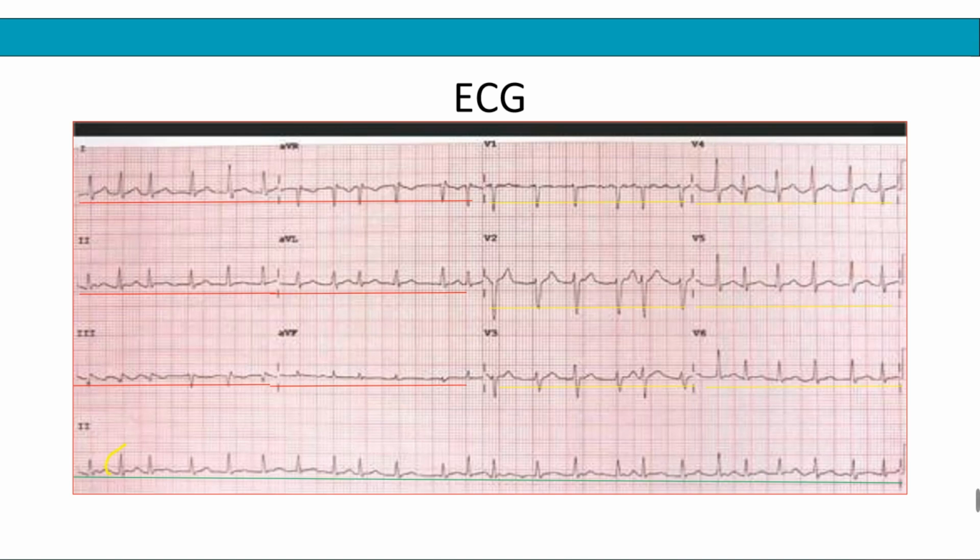So these are your QRS complexes. The frequency, how many of them and how regular they are, and their relationship to the P waves. Let's try to identify the various waves in this rhythm strip. This is the QRS complex I have circled in yellow. This is a T wave, a wave after the QRS, but the P waves are not very visible, so we can't really identify the P waves here.